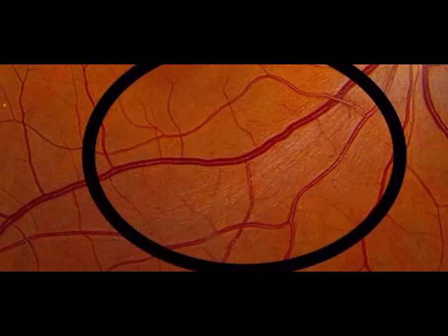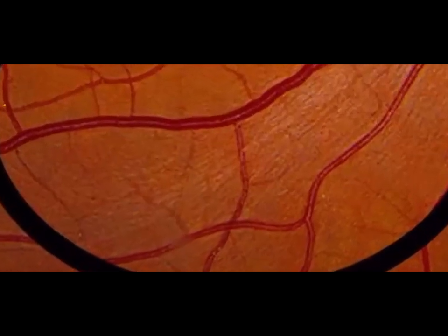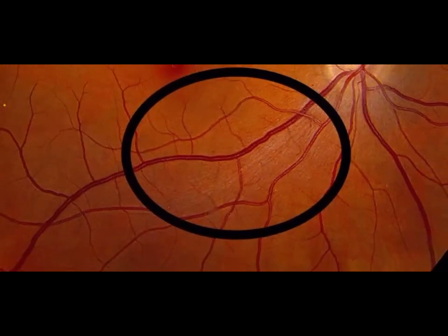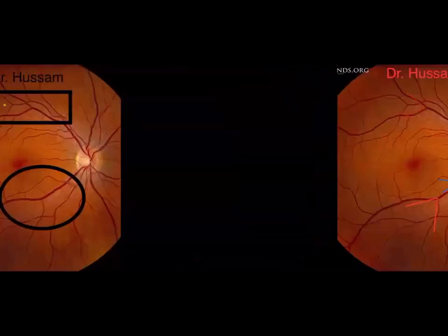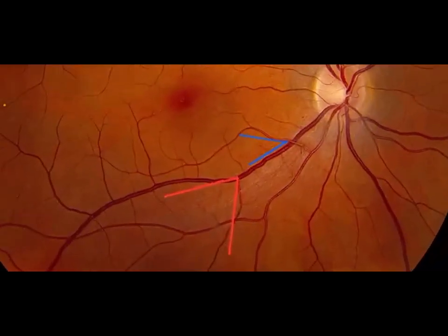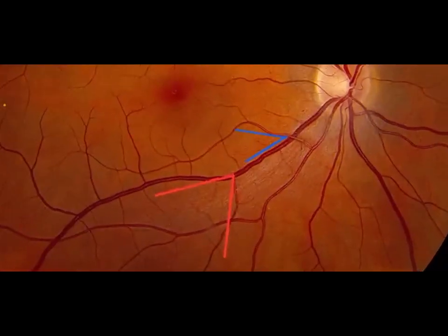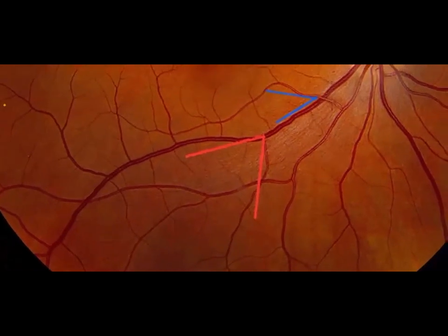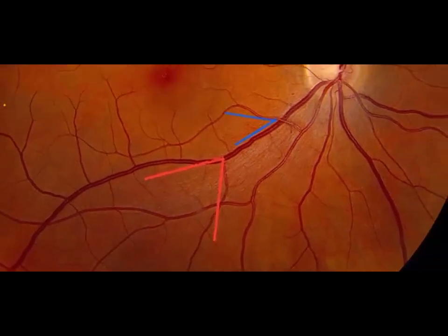You will find a V shape when there is a bifurcation in the artery. Can you see this one here? There is a small branch from the artery. This branch will make a V shape or an arrow, as you can see in the next picture here. By the branches of the retinal artery and the retinal vein, you will find some arrows, or V shapes. Use these arrows to point you towards the optic disc. Suppose you find this V, move forward, forward. You will find another V, move, move, move, another V, move, move.